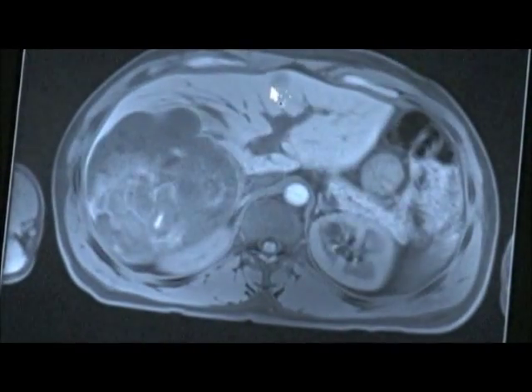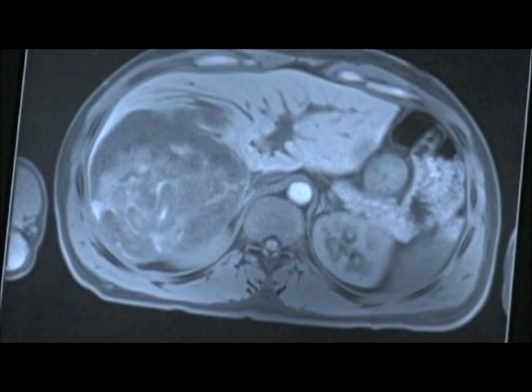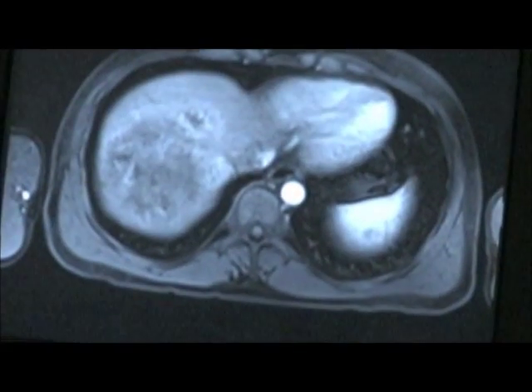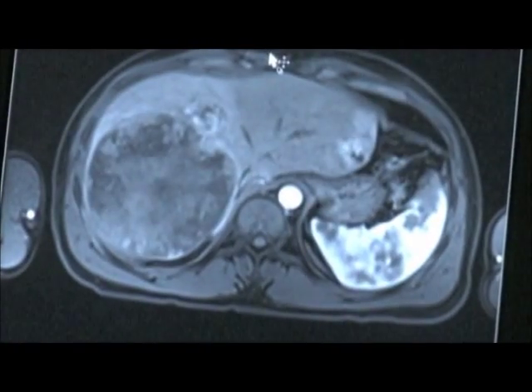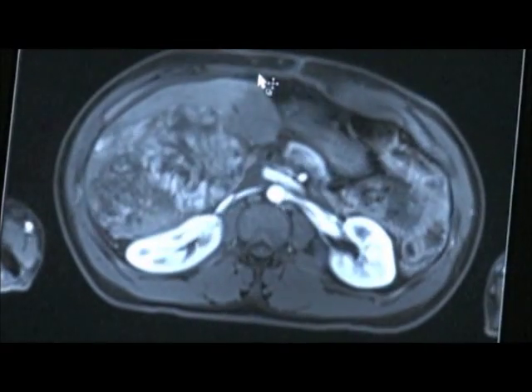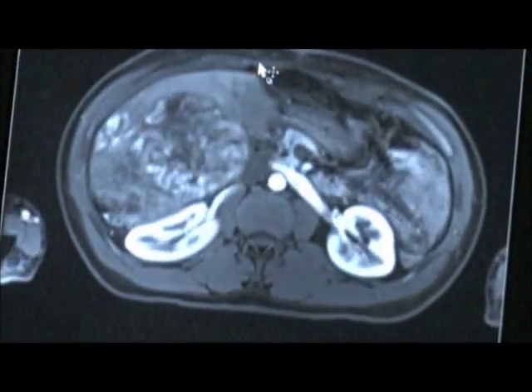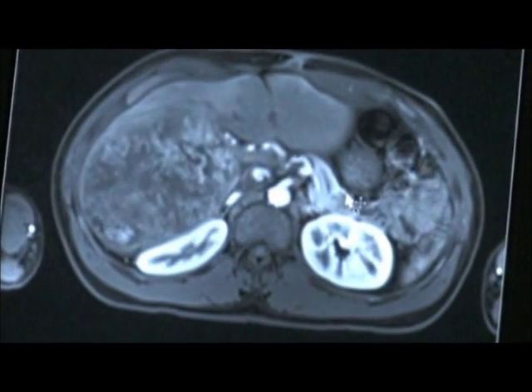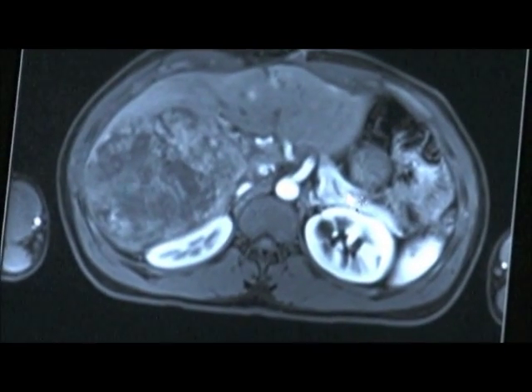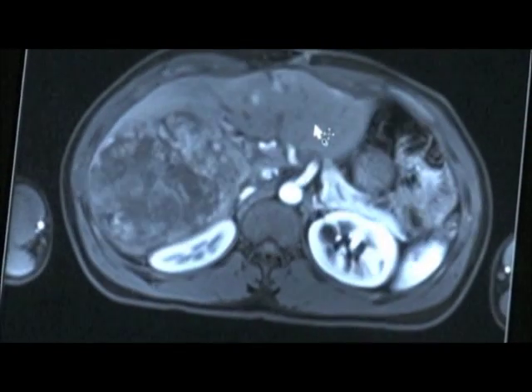Here we see another fat-suppressed T1 weighted image, also radial VIBE. Now, oftentimes the most important of our data sets is the hepatic arterial dominant phase T1 weighted image. And what I look for in everyone is that the pancreas is high signal intensity and enhancing greater than the liver on a correctly timed phase.